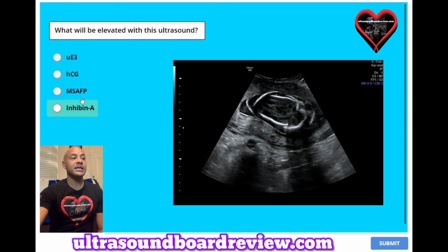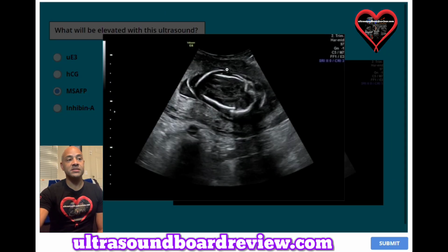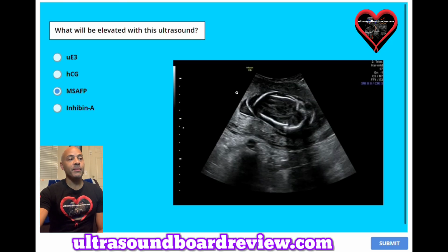The answer is C. MSAFP, and this ultrasound represents a fetus with fetal demise. Remember that MSAFP and AFP are the same thing. AFP is simply a protein that's released by the liver. MSAFP is a lab test used to detect AFP.